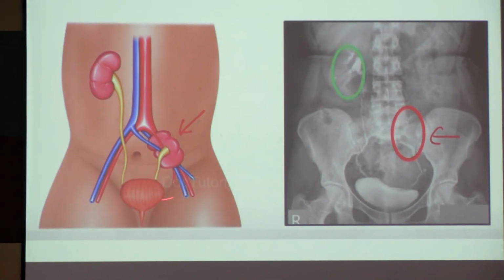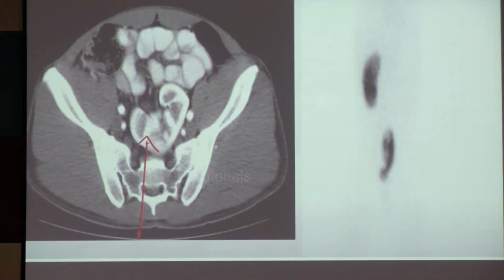So if this is the whole thing, you can see a very faint area, you can see this is the normal system. There's a small kidney out here, it is basically the ectopic kidney, right? Same thing, almost entering into the pelvis, there is a kidney sitting out there. So it is basically a CT scan plate showing this ectopic kidney.